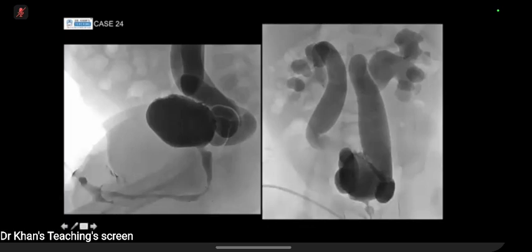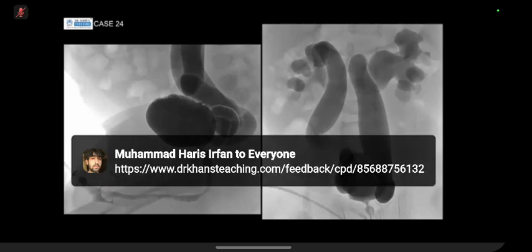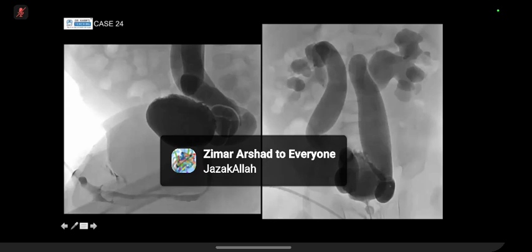What's the word? The posterior urethra looks normal on the lateral view. I agree. Okay. So knowing that the posterior urethra is normal, what do you now think is the diagnosis? Candidate 3. So bilateral vesico-ureteric reflux, and that's the definite abnormality, but the cause for this abnormality, if I can view any cause of neurogenic bladder or obstructive cause.